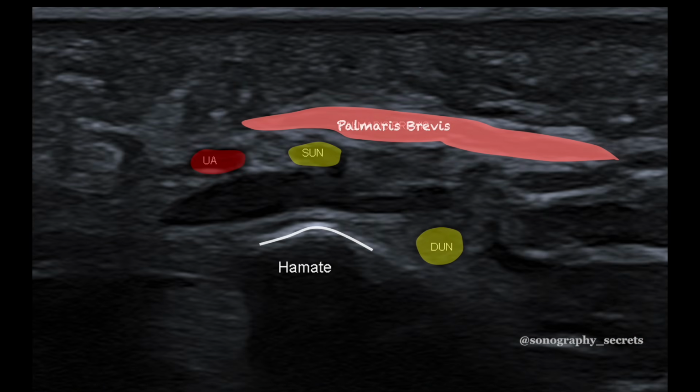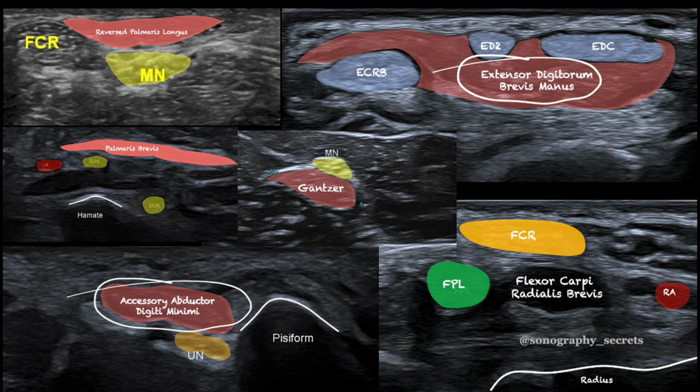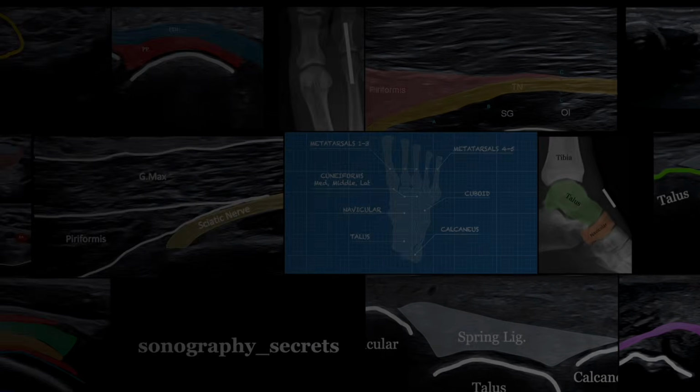There are a few more accessory muscles of the hand and wrist that have been reported in the literature that remain unchecked on my bingo card, though those just described certainly are the most common and significant that we'll encounter in ultrasound.